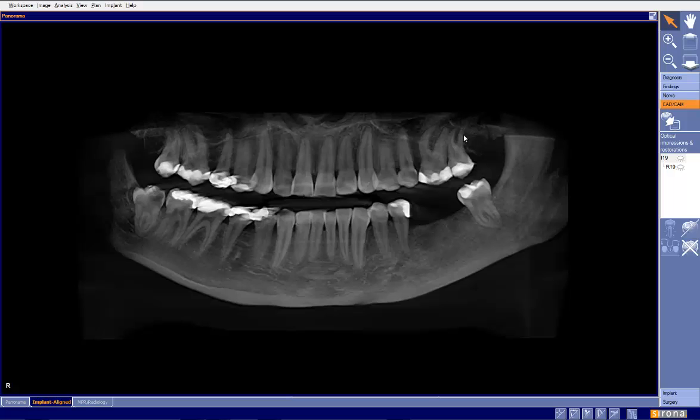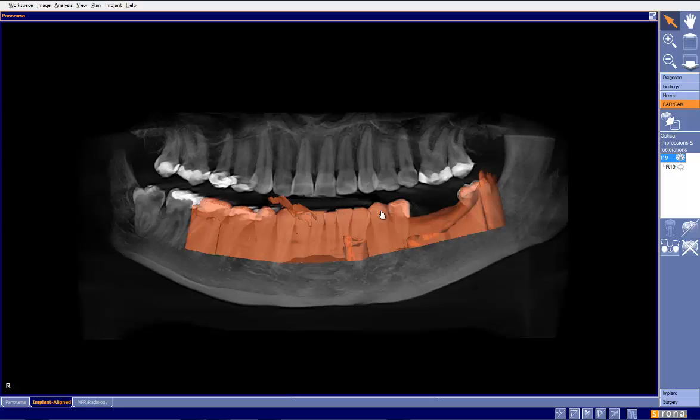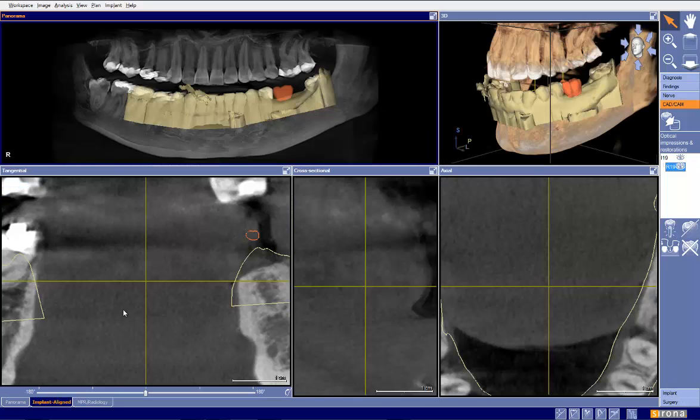We see this patient here. Obviously, we can see that we're missing teeth on the lower left-hand side. Looks like we're missing tooth number 18 and 19. We have a good case for an OptiGuide. The first thing I'll check is that we have good, well integrated CEREC data. We have a crown plan for at least site number 19. So we have everything that we need to plan a single implant.